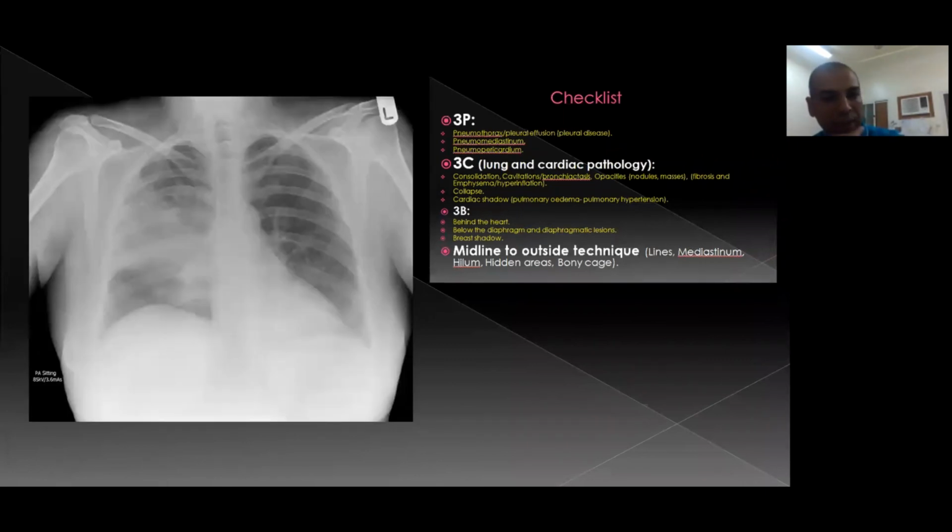Okay, this one I think is very easy, and I will take it myself. We have here a right lung lobe opacity with air bronchogram inside. This air bronchogram confirms that this is a pulmonary lesion with a patent central airway, and it is consistent with a consolidated, pneumonic patch. I think this one is easy to identify.